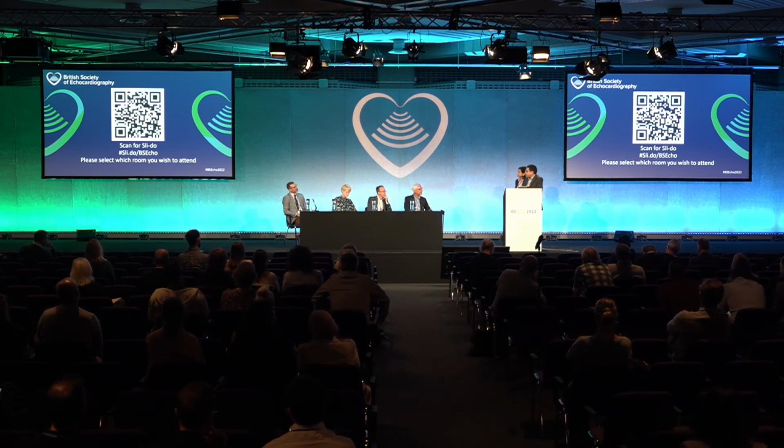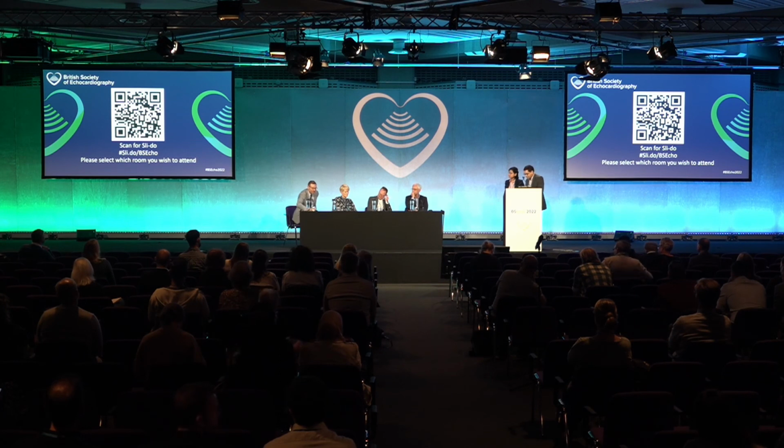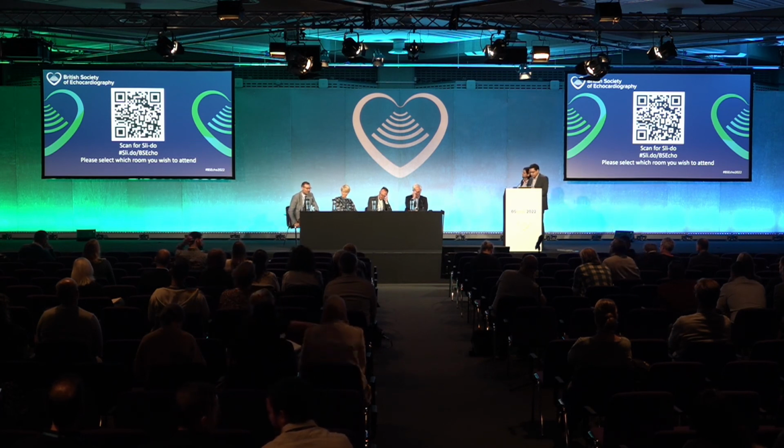So I think on your first case, you measured stroke volume on the LVOT and the ejection fraction. You had different stroke volume and transvalvular flow. Can I ask which is the way we should be measuring it and why the differences? Good question. I think there are errors in our assessment of stroke volume that come from the two measurements we make.